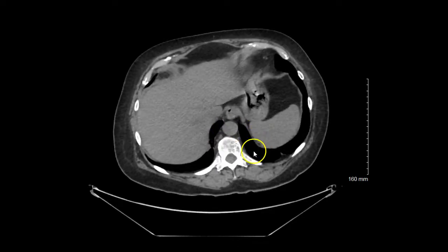This one is nice because we have the air of the lungs, we have the densities of the bones. You can see here the spine, you can see that posterior connection, those costovertebral joints. You can see the ribs as well. We have the solid liver, we have the spleen. We have a portion of the bowels here, the stomach, that's visible as well. So it'll give us a good sense of what these HUs are corresponding to for a given structure.